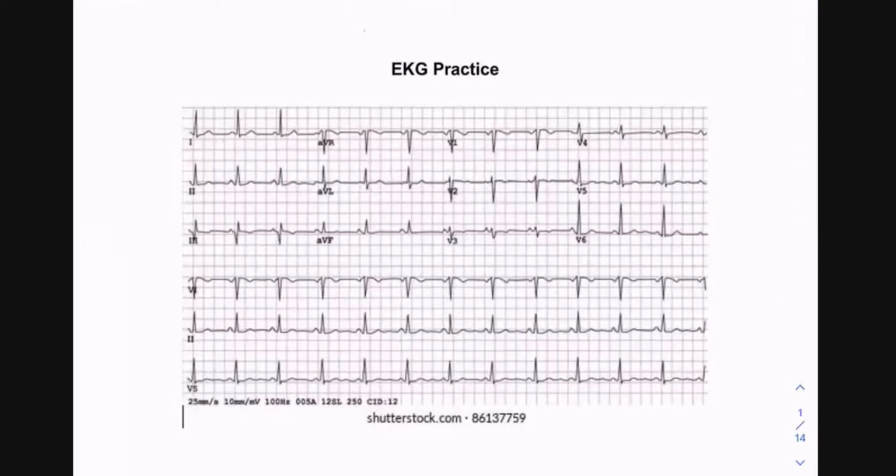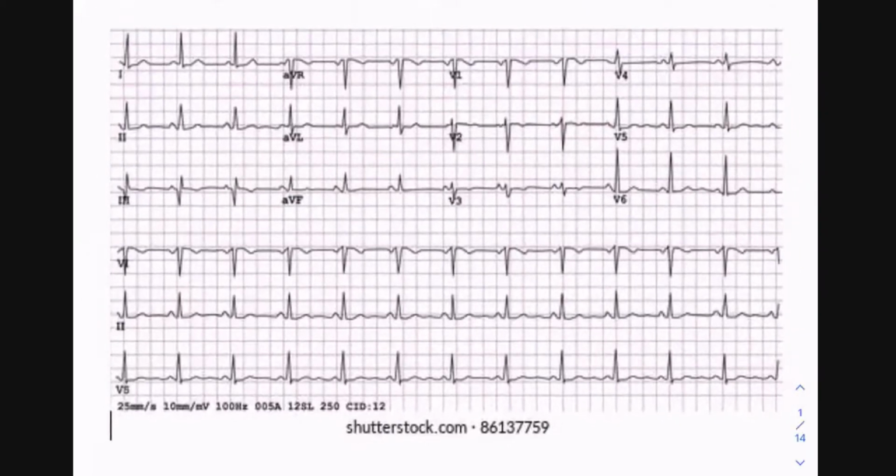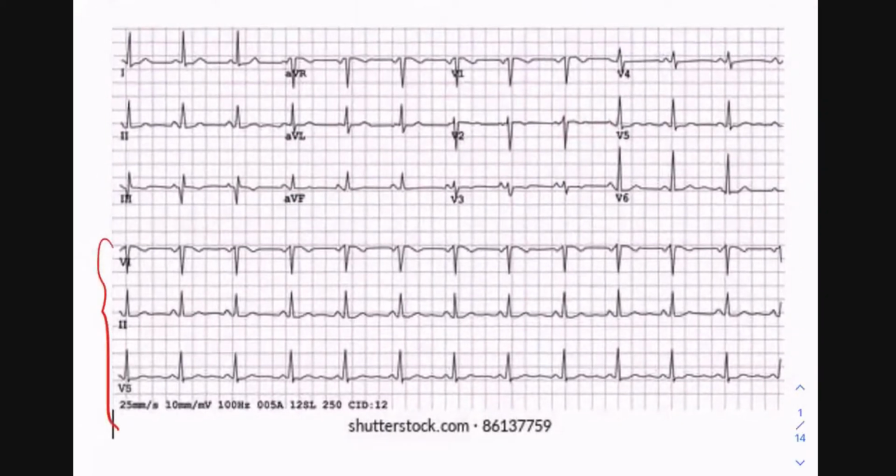In today's video, we're going to be reviewing a lot of different EKGs. I would recommend that when you see a new EKG, just pause the video, try to answer it first yourself, and then once you're ready to hear the answers, you can unpause. So let's get started.